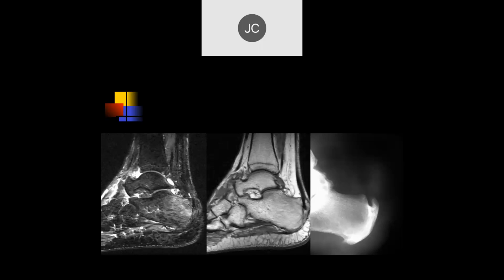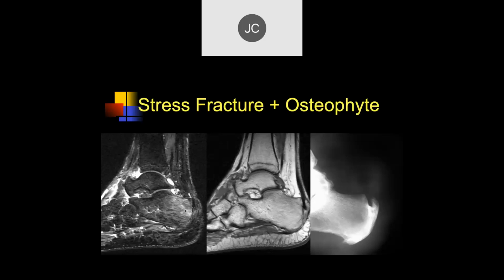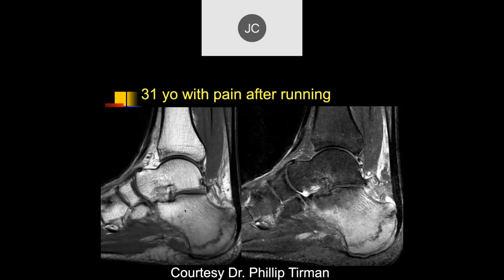And this was someone who was in their 60s, decided that they needed to lose weight, went out and started walking. And what we can see is that there's a traction osteophyte extending into the distal Achilles tendon from kind of overuse chronically. But here we can see that there's this subtle bone edema due to traction injury on the calcaneus. Good.